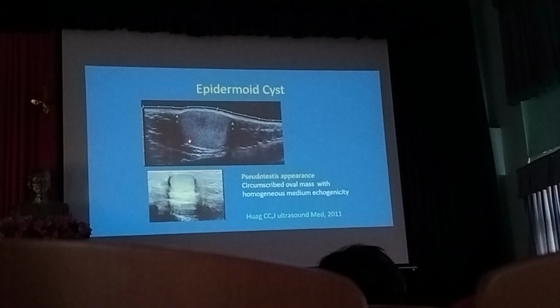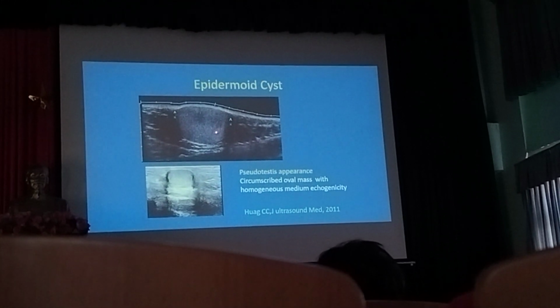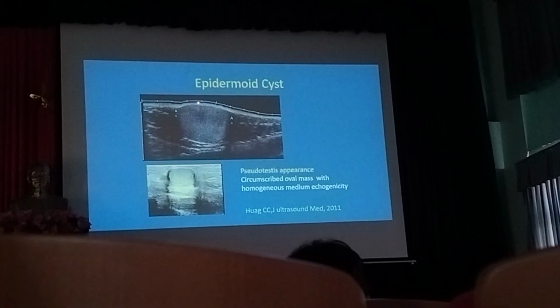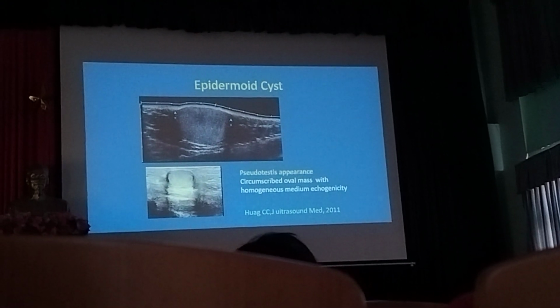Okay. And this sometimes it can be very homogeneous, and this is called pseudotestis appearance. Đôi khi các cái nang thượng bì sẽ có cấu trúc tương đối đồng âm và chúng ta hay có thể gọi là hình dạng tinh hoàn.